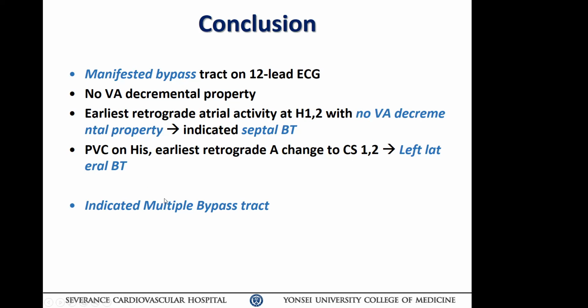So we can conclude that the patient has multiple bypass tracts, including a septal, anteroseptal, and left lateral bypass tract together.